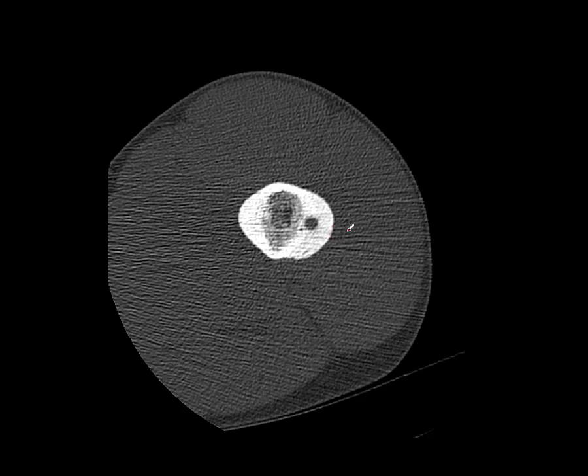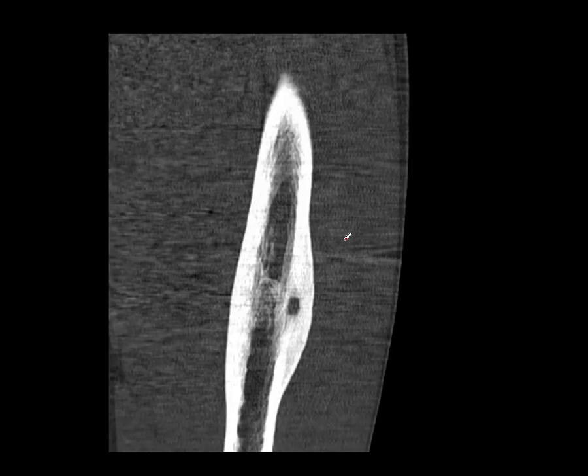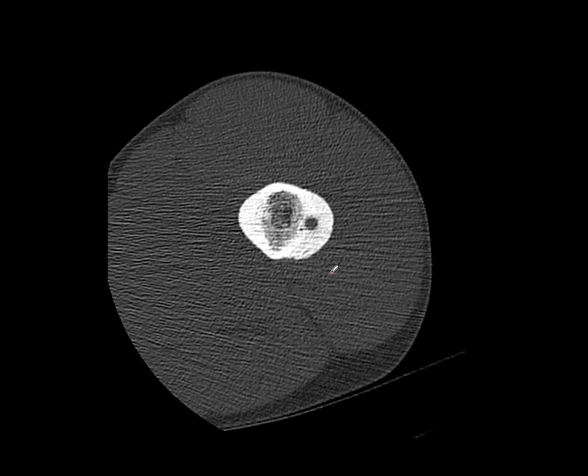Here's a conventional CT scanner, just like the image you saw earlier here. This one is a better quality, high resolution CT scan. And this is also showing us the nidus. Now, what you can see sometimes is an area of central calcification just in here, but we're not seeing it in this case. And here's the SPECT CT. You can see it localizes to the nidus.